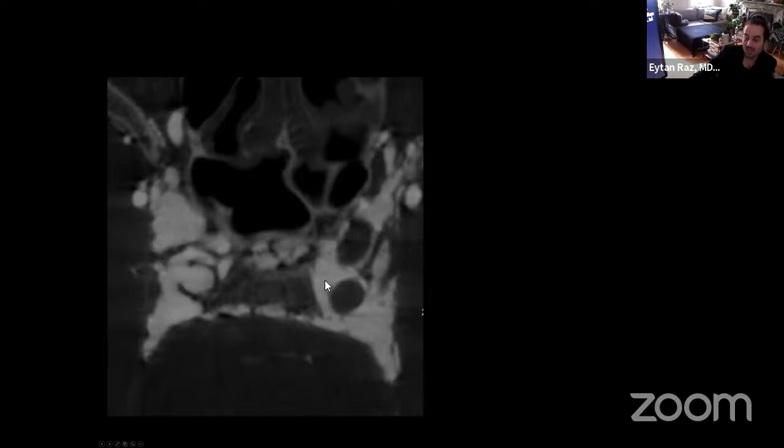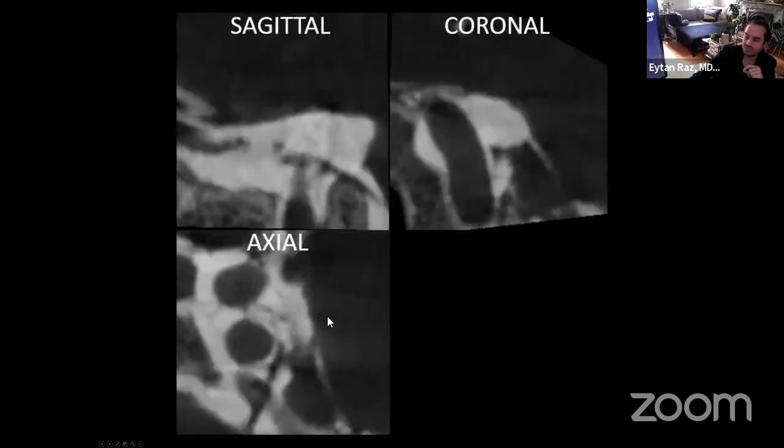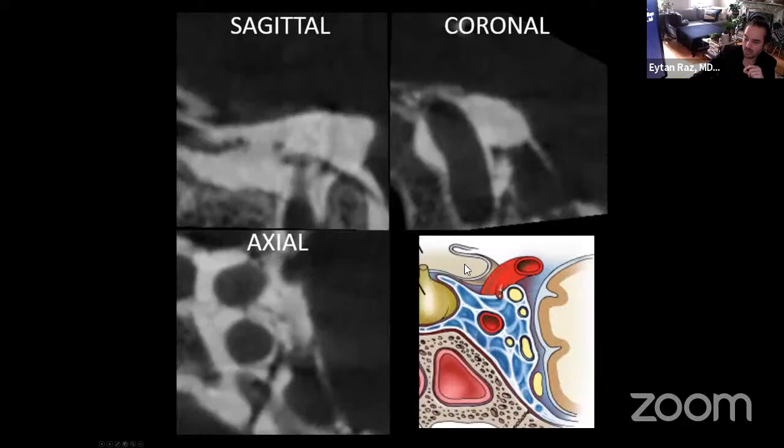But from this image, what became fascinating to me is the visualization of the contralateral cavernous sinus. Now you fill the contralateral cavernous sinus without filling the carotid when you inject from the right. And now you can see things so much better in terms of normal anatomy. And these are 3D reconstructions of that. Right, we know our anatomy of the cavernous sinus, and look at this.